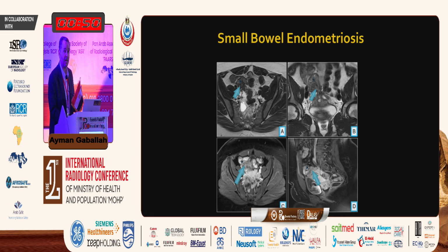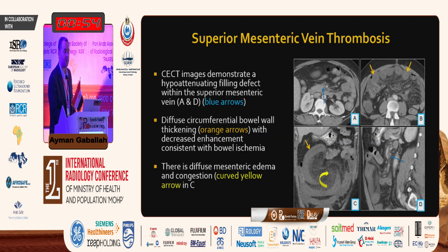So when you see that in a patient with known history of endometriosis, please consider that with specific and typical features as well. This is an emergency finding that you don't have to miss. Be careful not to miss any of these findings.